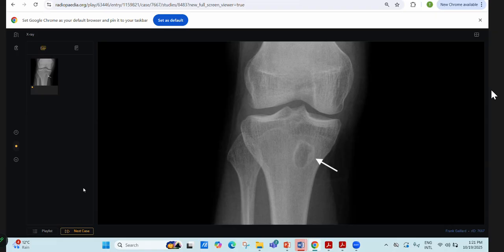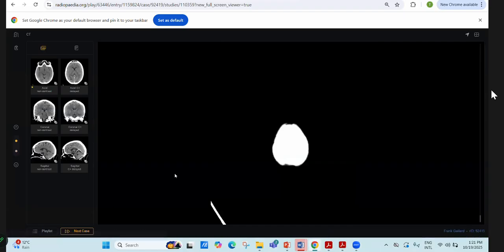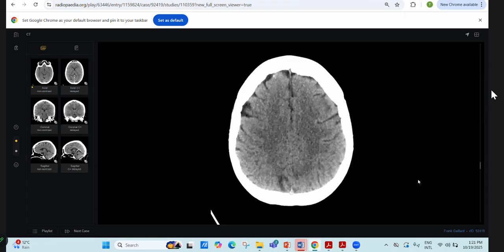Okay. Next case. This is not scrolling. Please scroll. I have already asked. Click the image icon, and yeah, okay, it's scrolling.